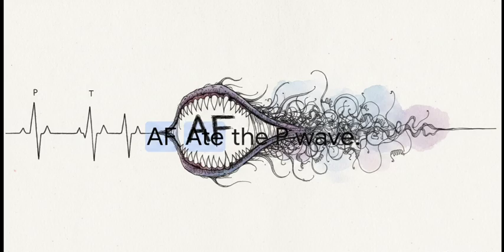And what exactly happens to that normal, healthy P wave we're supposed to see? Well, in AF, it is just completely gone. Poof. Just remember this punchy little phrase. AF ate the P wave. The baseline is entirely replaced by those chaotic, messy fibrillation waves.